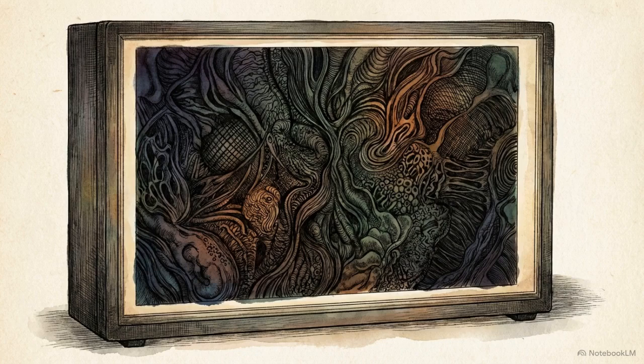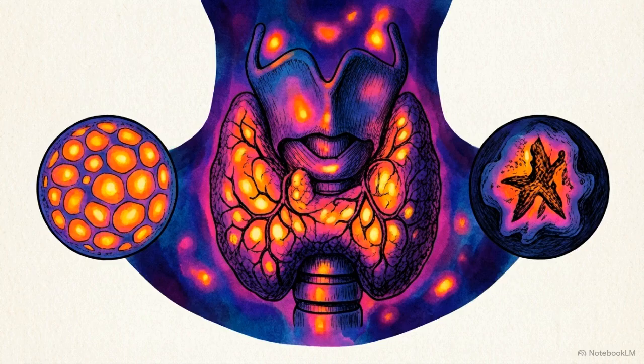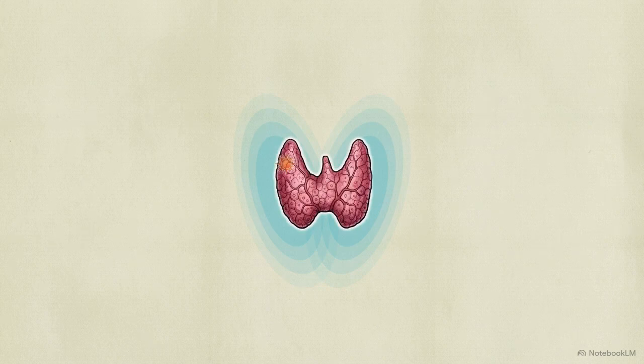When ultrasound data is insufficient, radiologists layer on functional imaging. Iodine-123 scintigraphy measures the actual physiological activity of the thyroid tissue by mapping where the gland actively absorbs radioactive iodine to synthesize hormones. This functional scan demonstrates a hot nodule. A single hyper-functioning nodule, or toxic adenoma, rapidly absorbs the radiotracer and glows brightly.